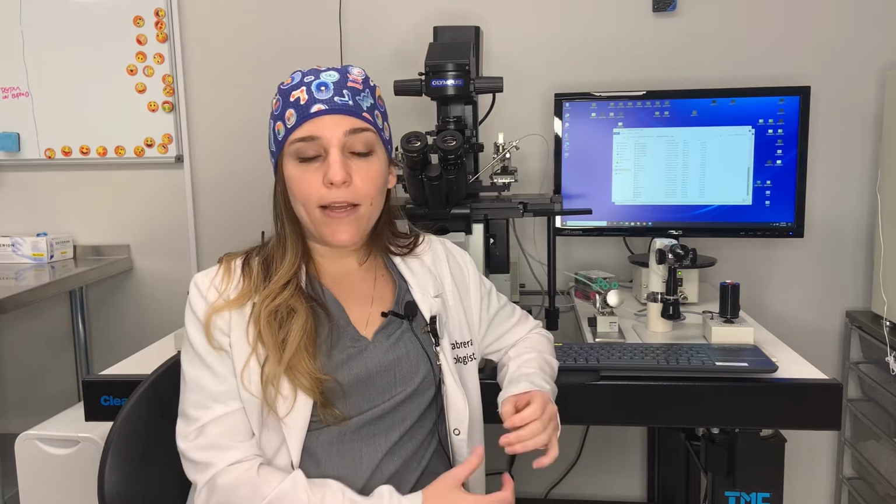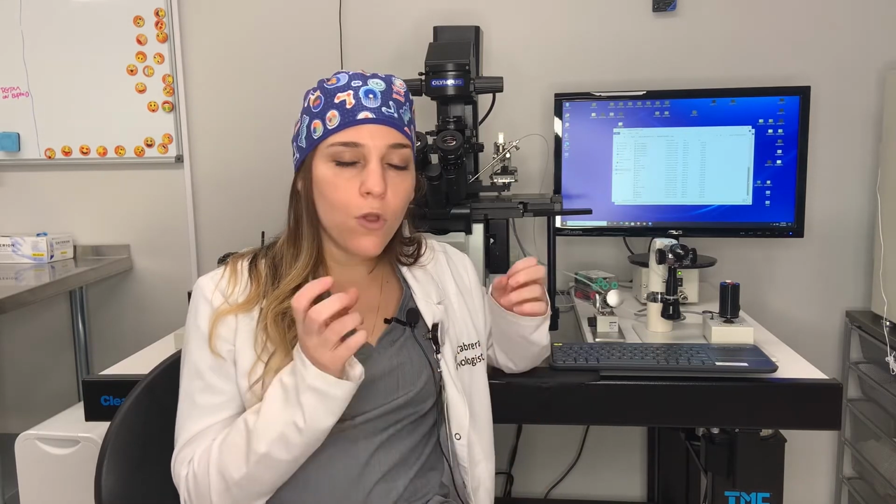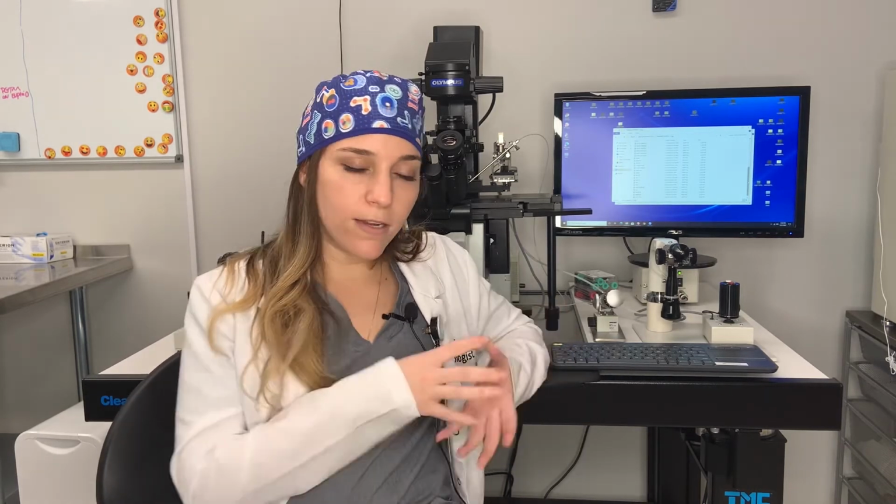Day 3, we actually count the cells inside the embryo and report how many cells are seen, and then we use a grading system 1, 2, and 3, 1 being the best, 3 being the worst, and we also take into account something called fragmentation. So when those cells are cleaving as they grow, sometimes tiny fragments break off and cause fragmentation inside the embryo. Completely normal, and eventually those pieces either get sucked into the compaction or pushed out when they become a blastocyst.